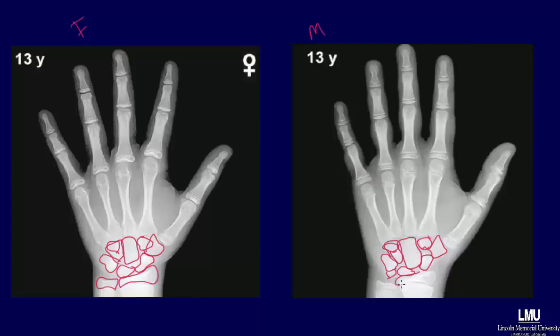Now I'd like to note that on this male's ulna process, there is actually a styloid process. And if we look at the joint space, we can see that the female's is much closer together and that the females have a flexor pollicis sesamoid and the males do not.